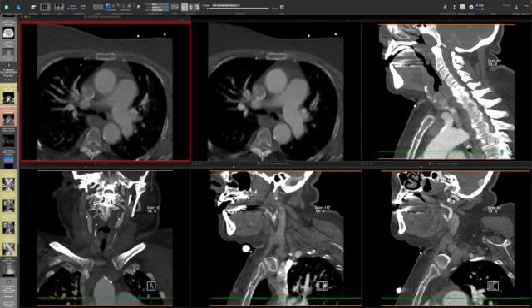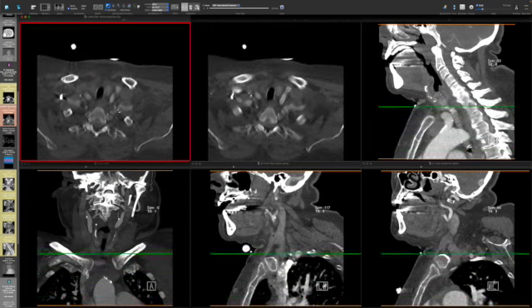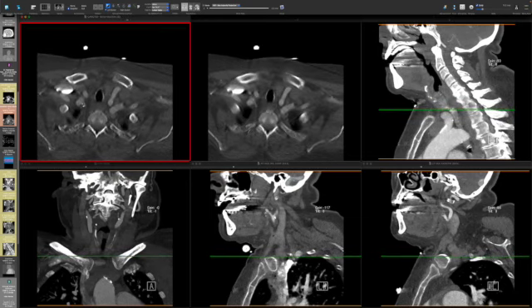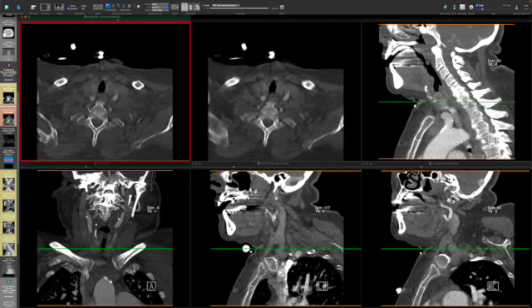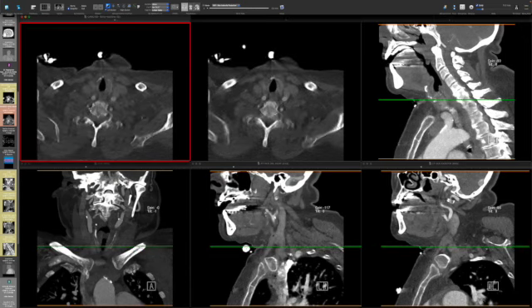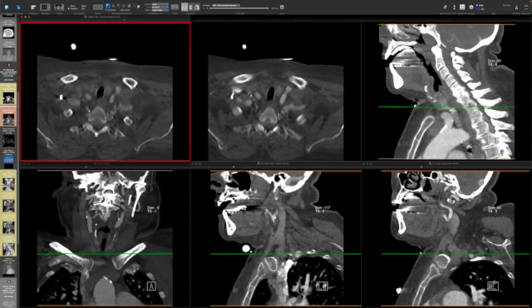Now we're going to run the vertebral arteries. The typical configuration for the vertebral arteries is they arise from the proximal subclavian arteries. So let's do the right side first. Here's right subclavian. Here's the origin of the right vertebral artery. The vertebral artery is going to come up. The V1 segment is where it's kind of in the supraclavicular region here.